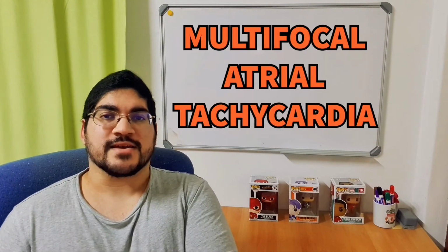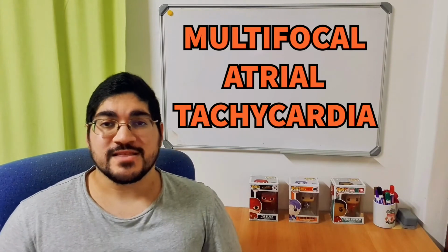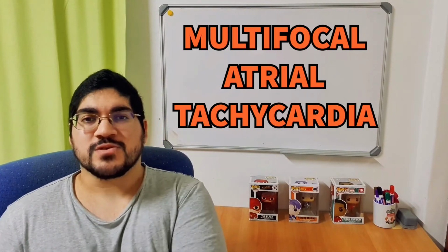And the last one we talk about is called multifocal atrial tachycardia. Same as atrial tachycardia, you've got an impulse coming from somewhere in the atrium causing a tachycardia. The difference being in multifocal atrial tachycardia, there are multiple impulses being generated. So you'll see different P waves on each QRS complex. The beats will be irregular because the impulses are asynchronous. They're not being let off at the same time. And that's it for narrow complex tachycardia. That's it for the tachycardias where the impulse is generated in the atria.